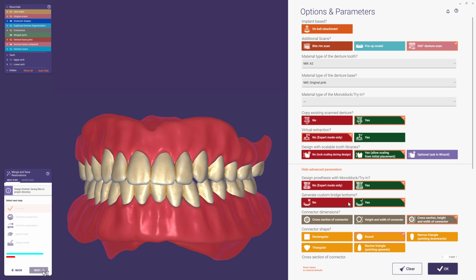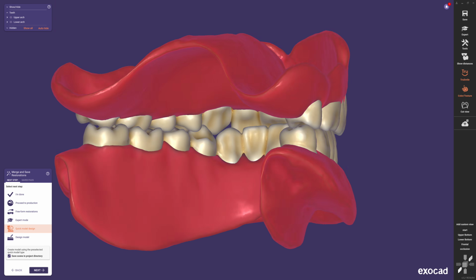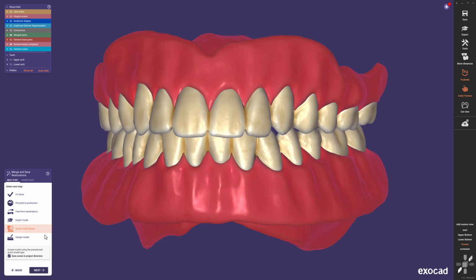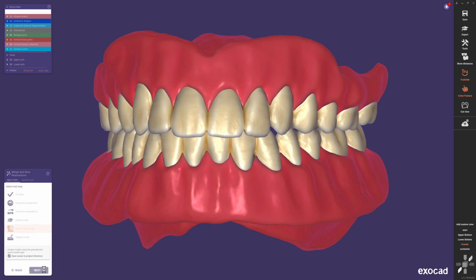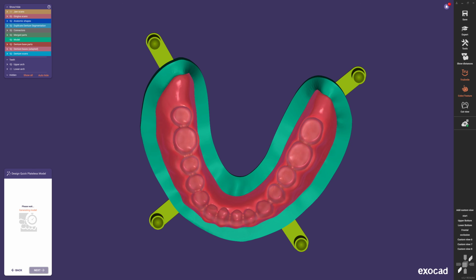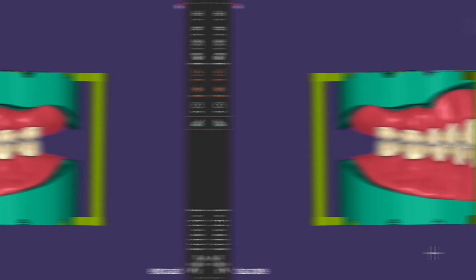To optimize your individual fitting parameters, please refer to our dedicated wiki page for detailed information of the ideal settings for your manufacturing process. With the denture models already reverse engineered, it is worth noting that they can be printed easily from here using the streamlined and highly automated quick denture model workflow.